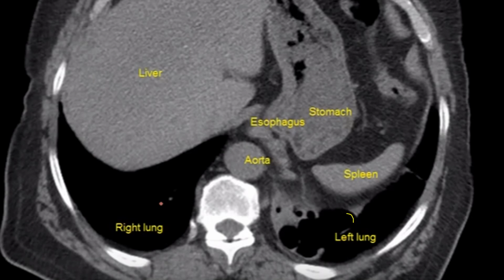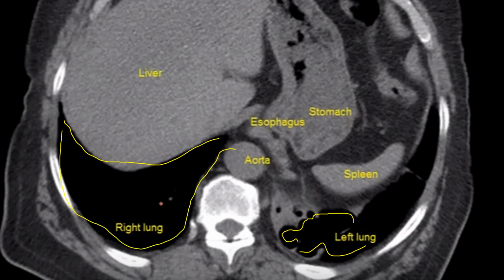And here, especially in that left lung, you see how down here in the left lung it's a little bit more atelectatic compared to the right lung? The right lung looks pretty darn patent. It looks pretty darn open. But here we're starting to see some atelectasis, because this is where the border of the lung is, right? So you can see this whole area in here is just sort of closed in. Why is the left lung, especially if a patient is supine, why is the left lower lobe in this segment, in this area, consolidated? Hopefully you said things like, oh, the heart, the stomach, all those are pushing down on that. Yeah, all those things are pushing down.